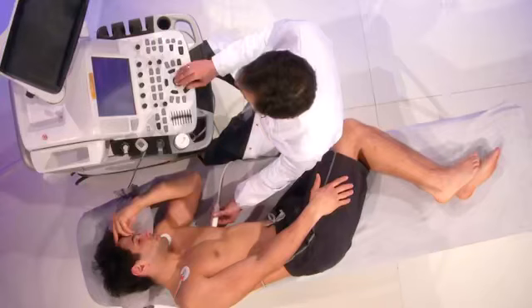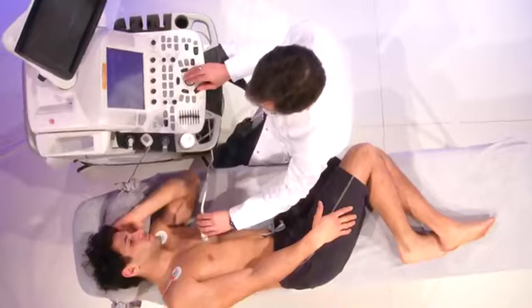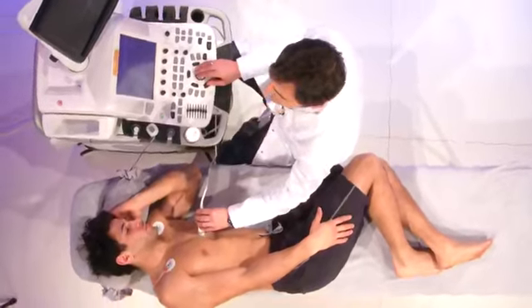of the mitral regurgitation. Echocardiography is critical to initial evaluation and longitudinal monitoring of patients with valvular heart disease. And just to let you know, mitral regurg is the most common valvular regurgitation. Today I'm going to focus on patients with secondary mitral regurg. When we look at these patients, one important thing is clearly to identify if it is a secondary mitral regurg or a primary mitral regurg.